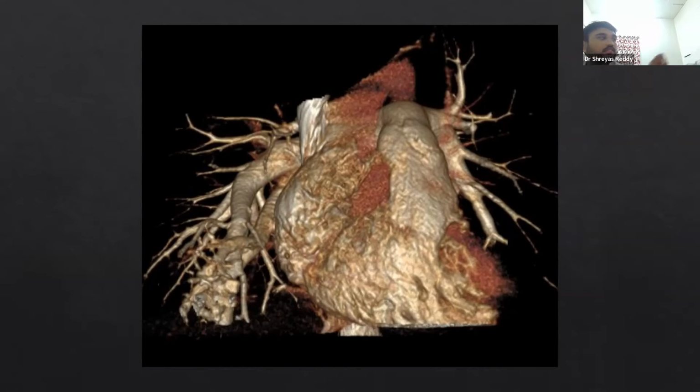There is one more very important thing. When you see a CT like this, there are cases where people have made a blunder. What is the one thing that you should keep in mind and never do? We should not biopsy this lesion. Exactly. We should always look at the contrast images of this lesion. Never attempt a biopsy just looking at the plain CT. I had a patient who was suggested a biopsy. Fortunately, he didn't get it done and came to us for an embolization.